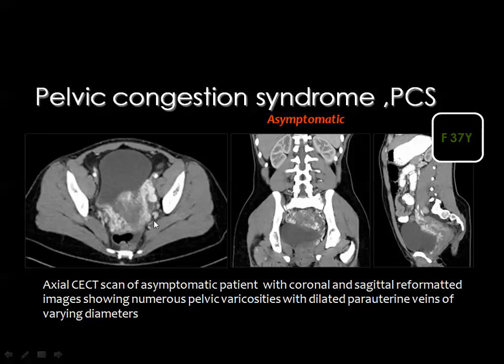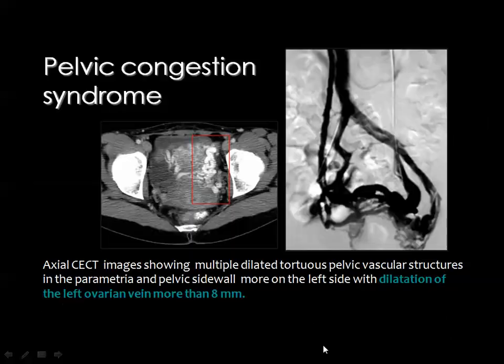And this is another example. You see dilated veins. This is seen many times in clinical practice, and I didn't actually find an explanation for this appearance before I knew that this is the pelvic congestion syndrome, and you know that many of these patients are usually asymptomatic.